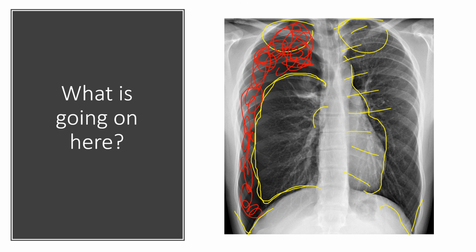All that there is a pneumothorax. That's pretty crazy, right? And so here's your carina, which I know all of you guys love it when I do this. So all this is that pneumothorax on that right side, causing that pushing of the lungs into that small space over there. Now, obviously, notice what happened to the trachea. The trachea got deviated towards the left.